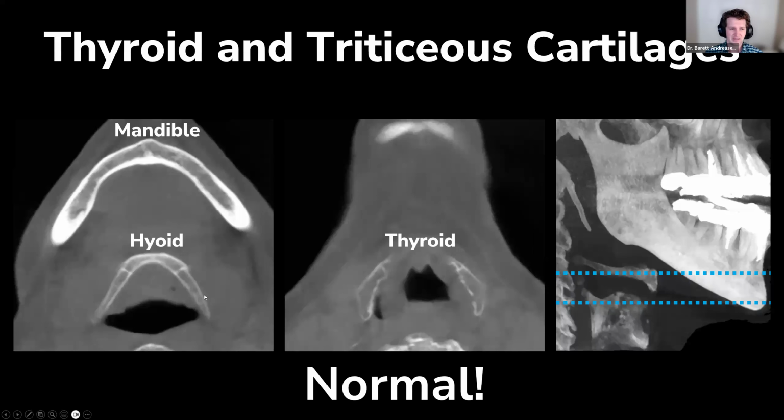So the hyoid bone comes around this airway here, scroll down, you hit the thyroid. And if you're taking any scan that captures below the hyoid bone, you're probably going to have some portion of the thyroid. It might just be the tiniest portion of these horns that are sticking up there. That's most typically what we'll see on smaller scans, but in a larger scan, you'll often see quite a bit of this thyroid cartilage.